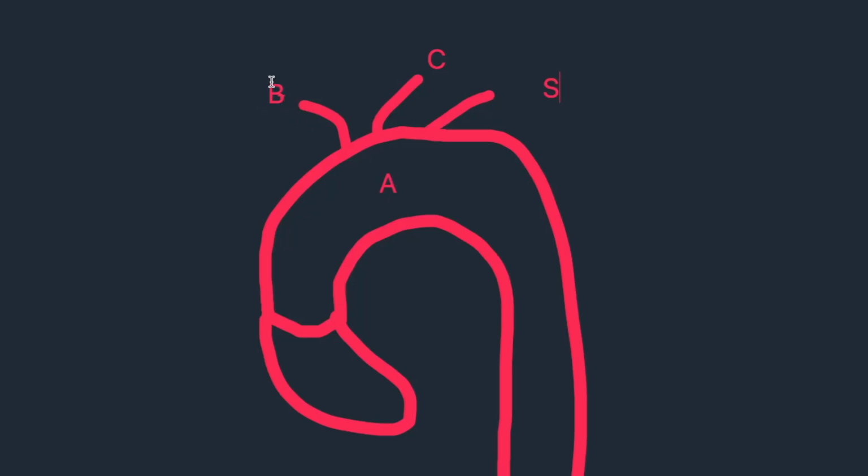You'll see eventually on the imaging that the brachiocephalic artery supplies the right common carotid artery as well as the right subclavian artery. The branches off the aortic arch, the left common carotid and the left subclavian artery, come directly off the aortic arch. Hopefully that's a helpful mnemonic in case you get mixed up whenever you're thinking about this vasculature deep in the chest, the basis of where blood is going to be coming from the heart. You can always go back to your ABCs.